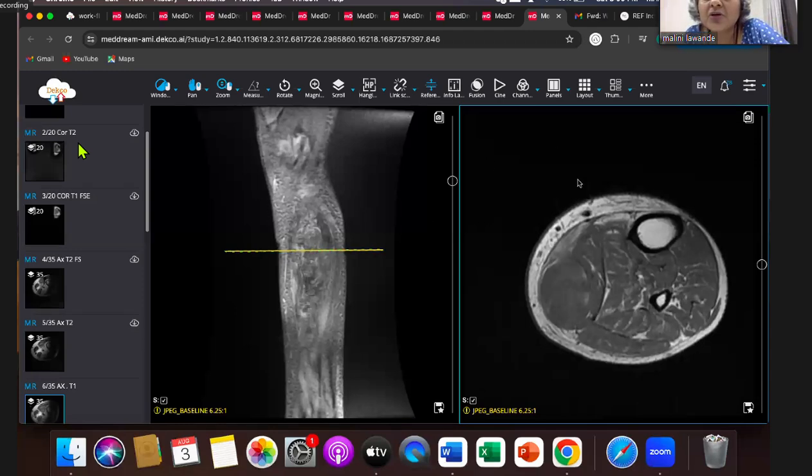Heterotopic ossification and osteosarcoma. Yes, myositis ossificans and osteosarcoma pathology looks the same. That's the reason you don't want to biopsy this, because it will come as an osteosarcoma. That peripheral rim of ossification is very typical. PD, no. Here, PDs have been done because it's part of the protocol, but in tumor, PDs don't have a role.